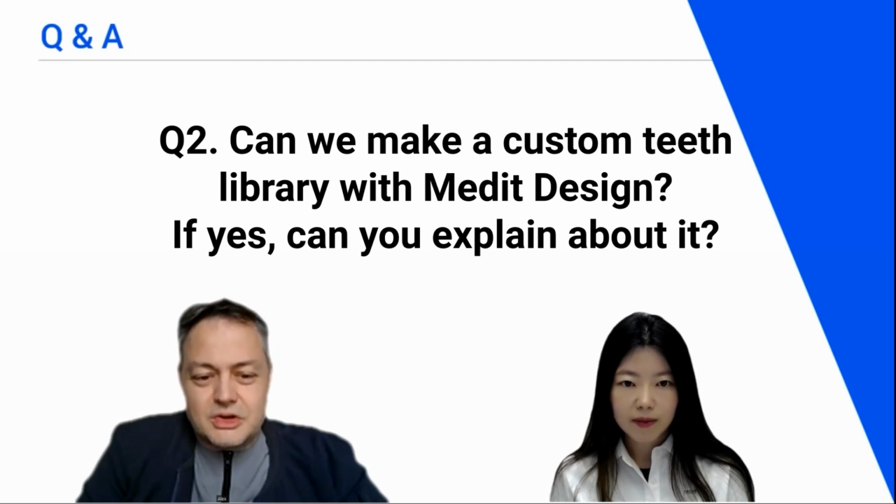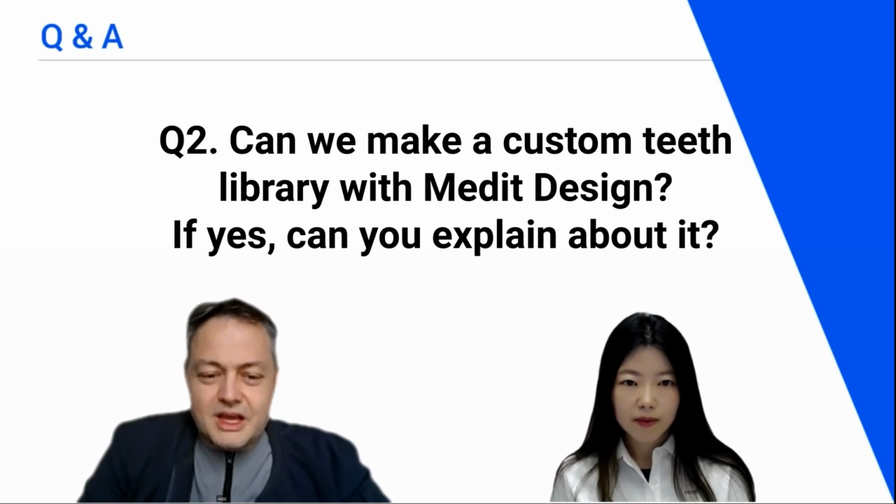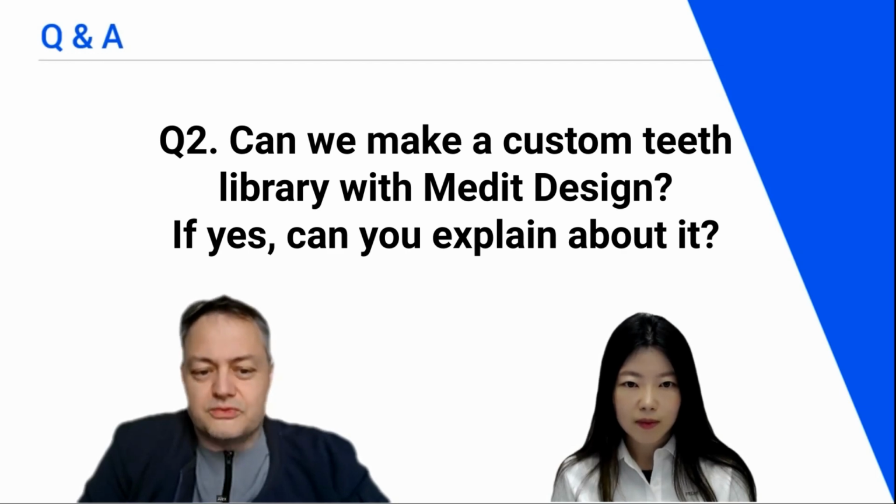And Medit Design offers a custom base, and you place the custom base in contact with those teeth that you just imported. You Boolean merge it together, and now that you have a base with the teeth from Exo, you can go further, because Medit Design does not export in the library format of Medit Clinic Cad.